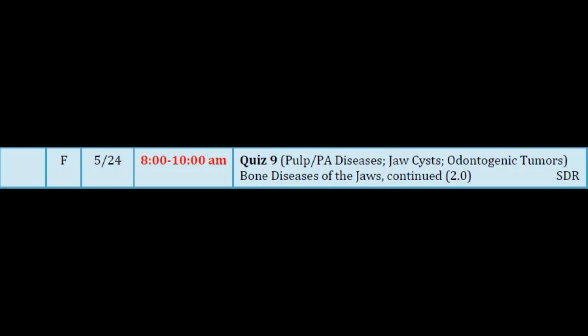All right, number 6. What do we see radiographically? Is it lucent, opaque, or mixed? Is it multilocular or unilocular? Unilocular. What is its relationship to normal structures? Surrounding the crown of an unerupted tooth and attaching at the cemento-enamel junction, it can only be one thing as our top choice, the dentigerous cyst. Could it be something else? Yes, but by far and away, the dentigerous cyst is the most likely and most common thing that presents.